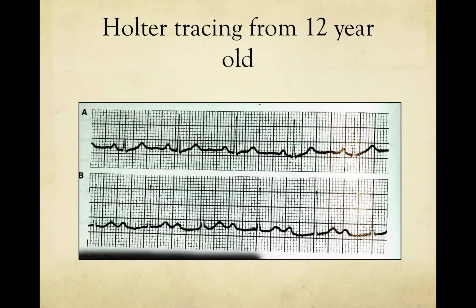But the QRS looks kind of similar, I think. It's at least narrow. Now, could that be a sinus rhythm with isosynchronous beating of the QRS at a similar rate? It looks like it's conducting with first degree heart block, but in fact, it's not conducting with first degree heart block at all.